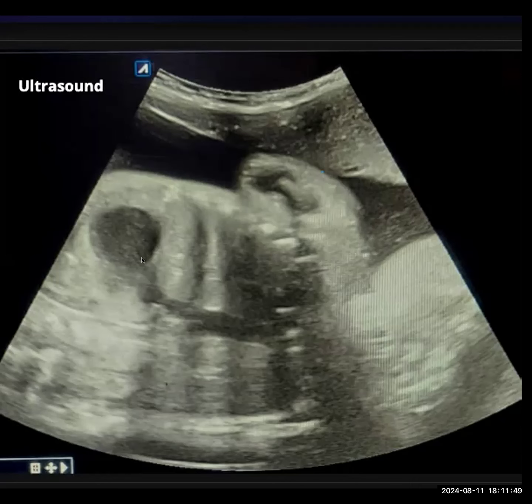This does not look like a stomach because it is very rounded in shape. A distended gallbladder could also appear, which in my routine practice, I would see the situs of this patient and see where the liver is. Anything else abnormal in the image that you're being shown?